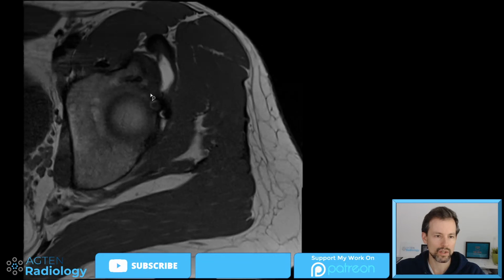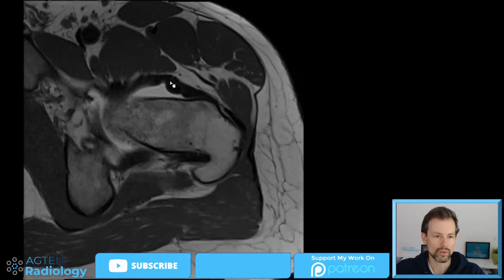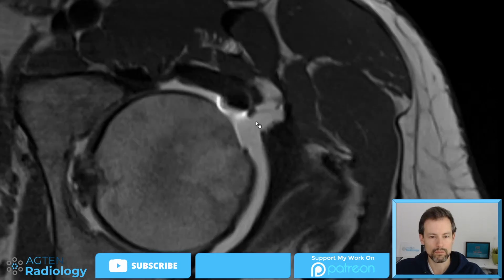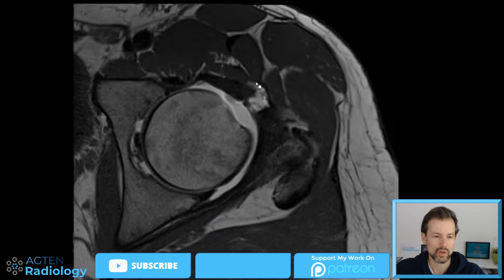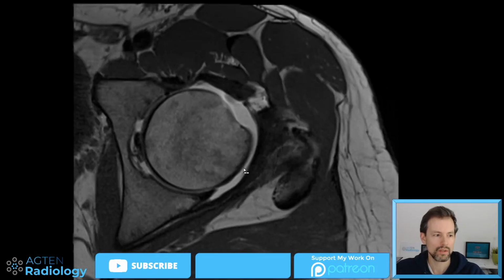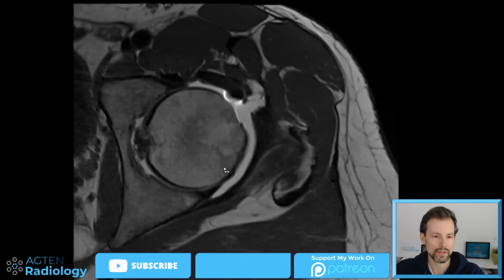Then we've got some scar tissue here, some adhesions. So I think all of this is a lot of scarring going on, and also the joint capsule might be thicker than it normally is. In this gap, there are also these small adhesions, all this tiny stuff there, covered by the membrane that they already saw in the arthroscopy report. So remember, the arthroscopy report that I'm showing was done after this MR. So basically what they see is what we should be able to see here.